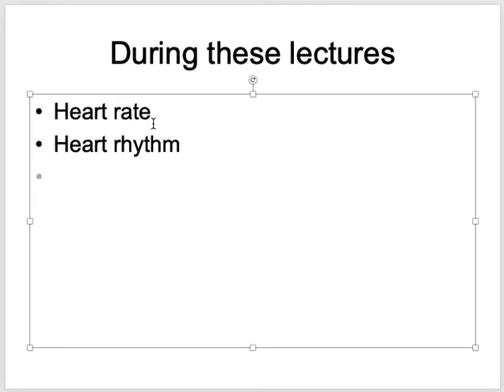Other than that, we saw how we can check the cardiac axis. If you remember, that 1, 2, 3 lead method, or that aVF lead method, right? So whatever you like.